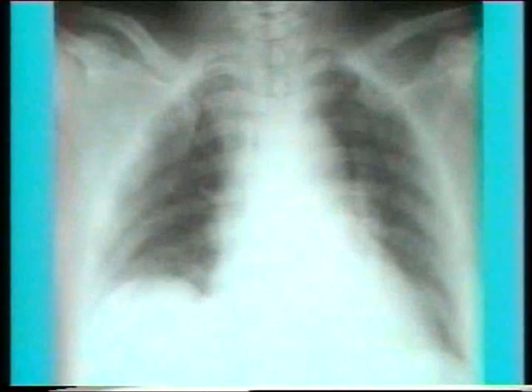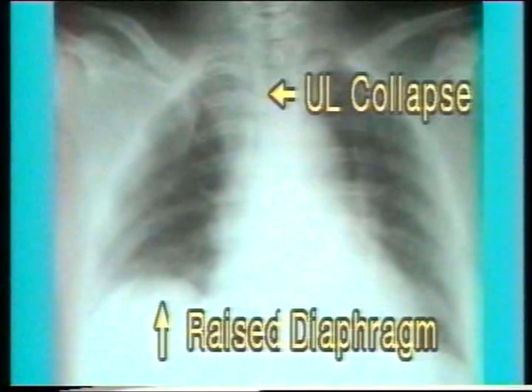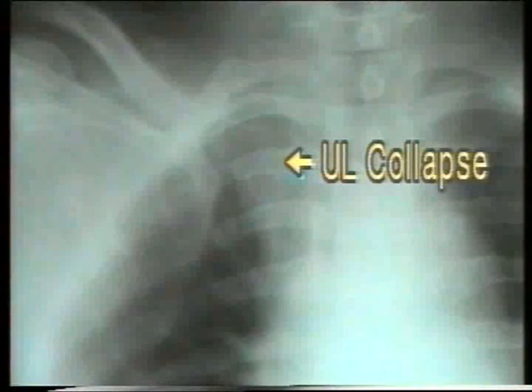This patient developed sudden breathlessness and severe hypotension on the second postoperative day following cholecystectomy. Note the collapse consolidation of the right upper lobe suggesting pulmonary embolism. The differential diagnosis will be aspiration or mucus plug obstructing the upper lobe bronchus, which was ruled out on bronchoscopy.